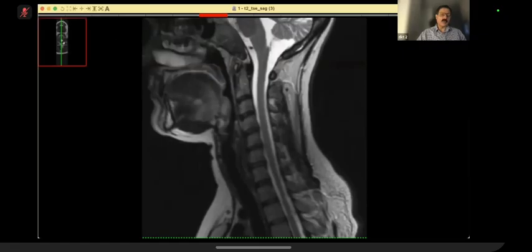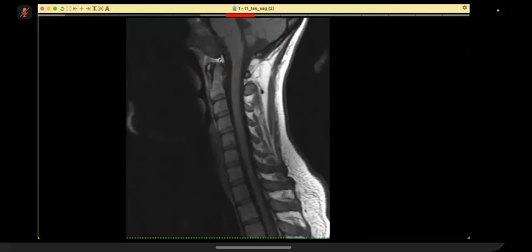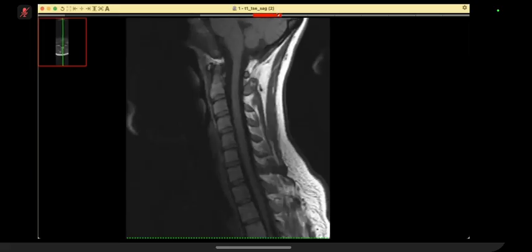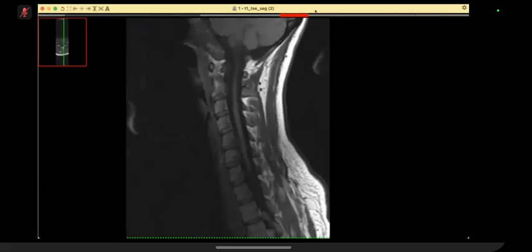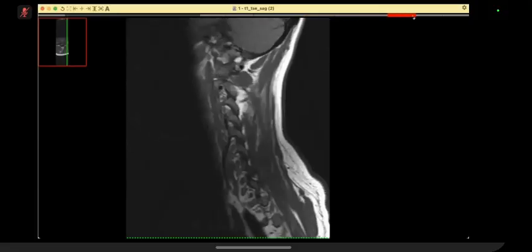Don't use the mouse now. Okay. I've given you a T1. Over to you. Yes. So these are T1 weighted images. I am focusing on the marrow signal. Again, in the clivus, I can see the marrow signal is altered and it looks abnormally of low signal intensity. I am trying to search if there is any destruction. I can also see there is an expansion here. So this is an abnormal T1 signal affecting the clivus.